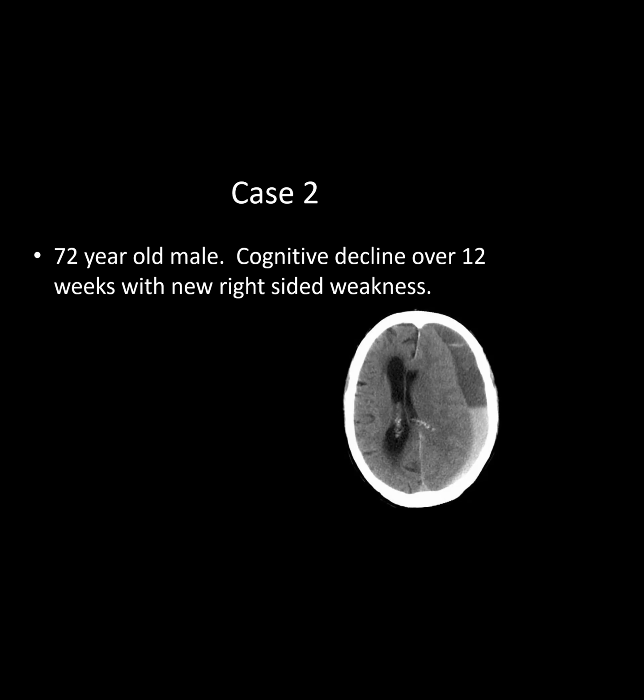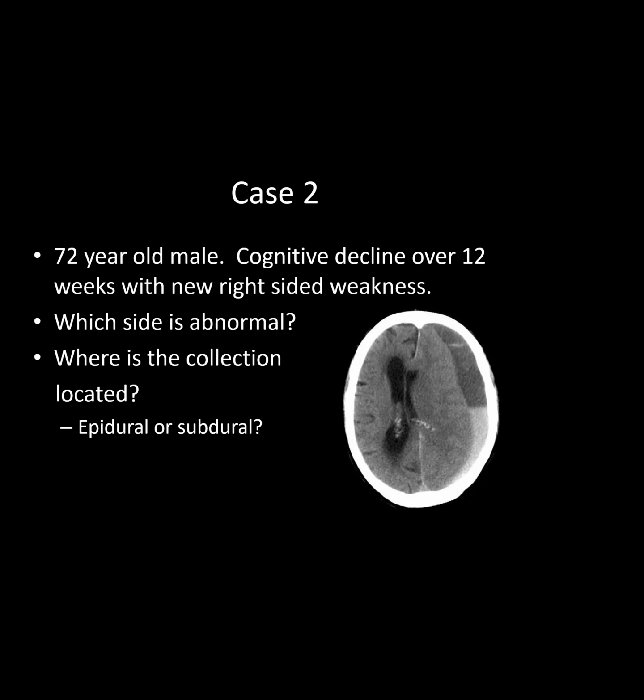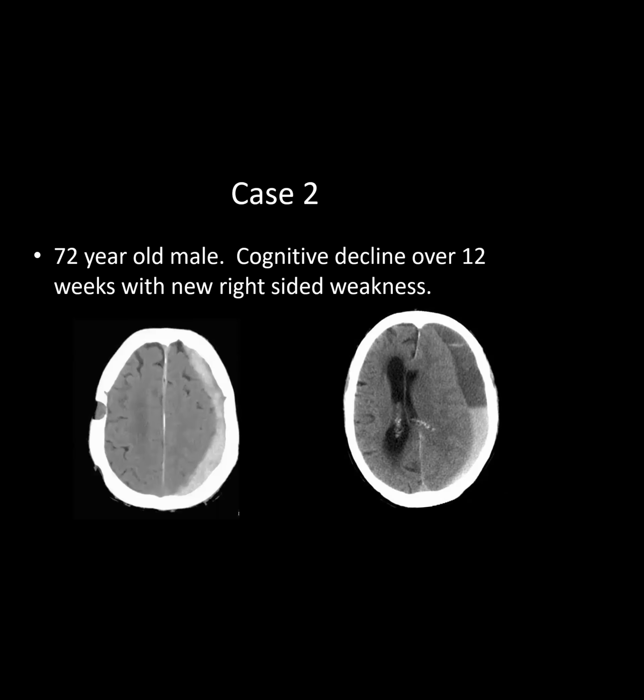When they get to the midline, subdural collections, whether it's a hemorrhage or an empyema, will either stop or go along the falx or the tentorium. So this is an example of an acute on chronic subdural hematoma because you see layering. There's a hypodense chronic component plus newer blood over here. This is either blood or a membrane. In addition to the hemorrhage, other pertinent positives here are mass effect. There's rightward midline shift, compression of the ventricular system, and probably some subfalcine herniation. So is it epidural or subdural? It's subdural for the reasons that we talked about.